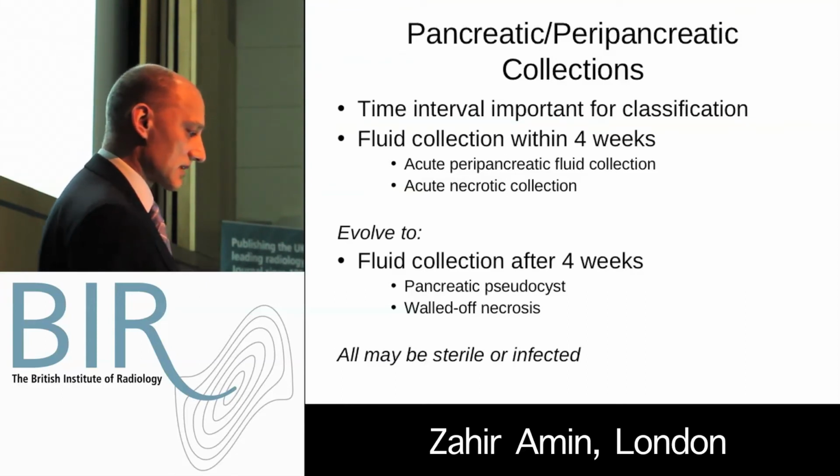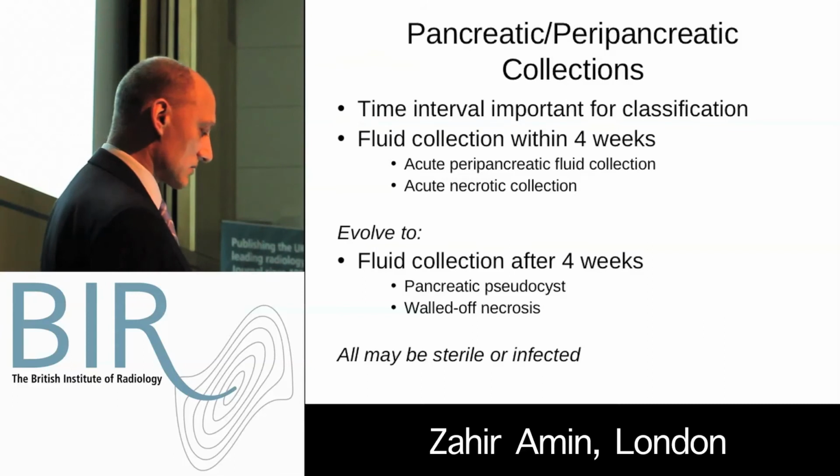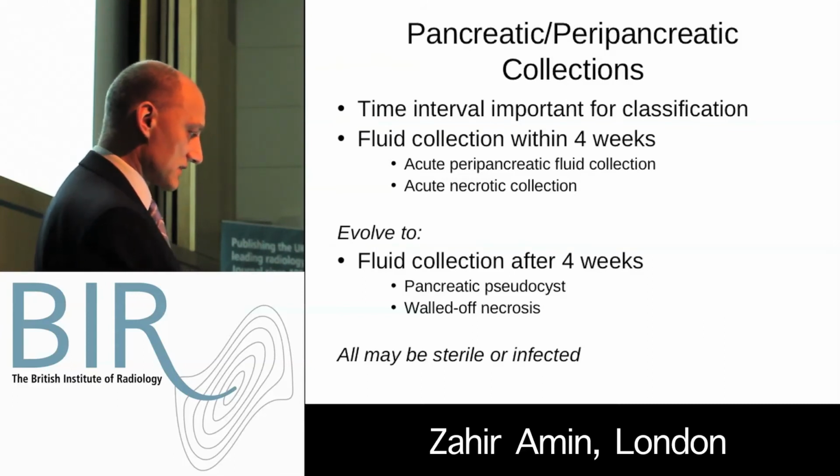And these collections evolve usually after 4 weeks to walled-off collections. So if it's a walled-off simple fluid collection without any solid material, it's called a pancreatic pseudocyst. It's usually thin-walled without any solid content.